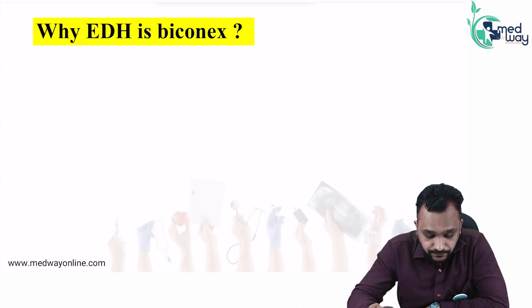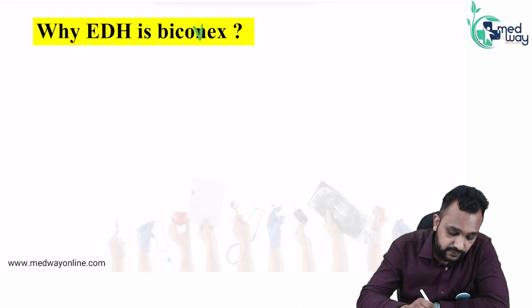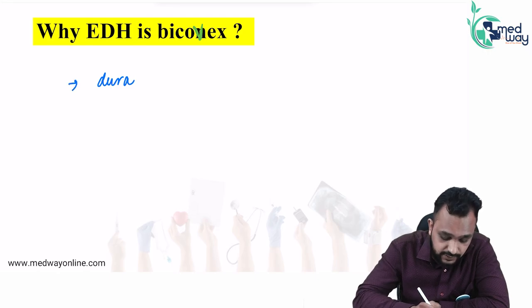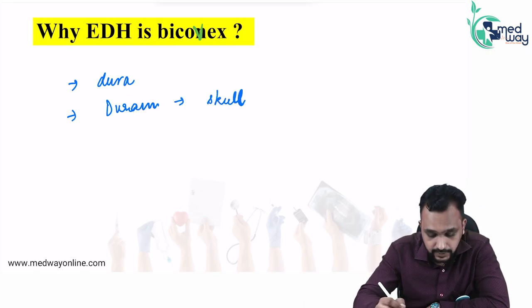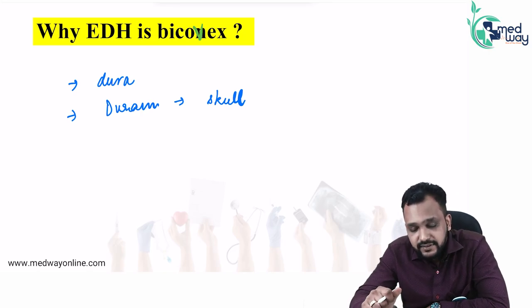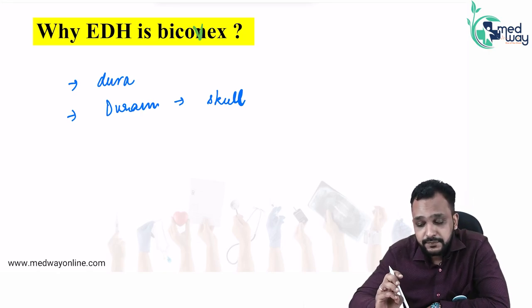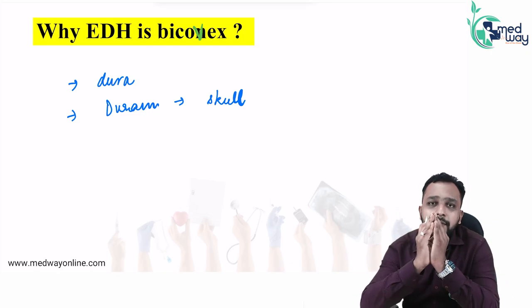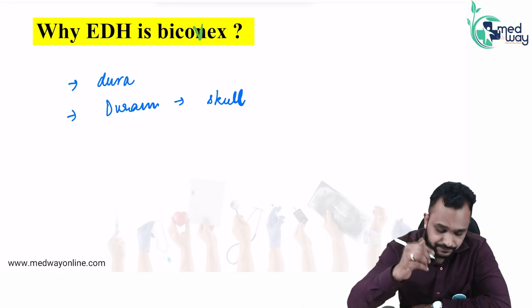Now what happens? This extradural hemorrhage is biconvex because it is outside the dura. Extradural means this bleed is outside the dura, and we all know that dura mater is firmly attached to the skull, except at places where there are vessels traversing within the dura mater, right? So whenever there is a bleed, it is going to splay the dura mater, and that splaying of the dura mater will result in a biconvex shape.